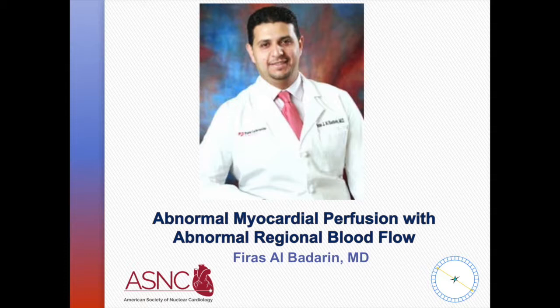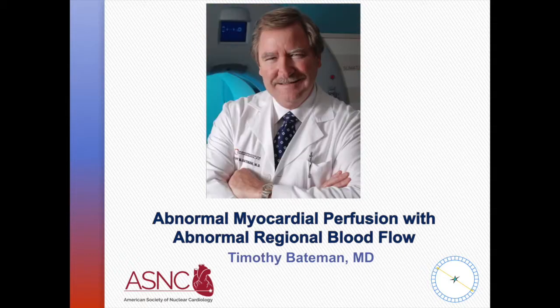You're only seeing the area that's most severely involved, and you might be missing other less severe or more subtle deficits. Here comes the value of PET with a multi-parametric input, where you can use different pieces of information from different domains of ventricular function and myocardial blood flow that help you form a better understanding of what could be going on. Okay. Well, that's very good.